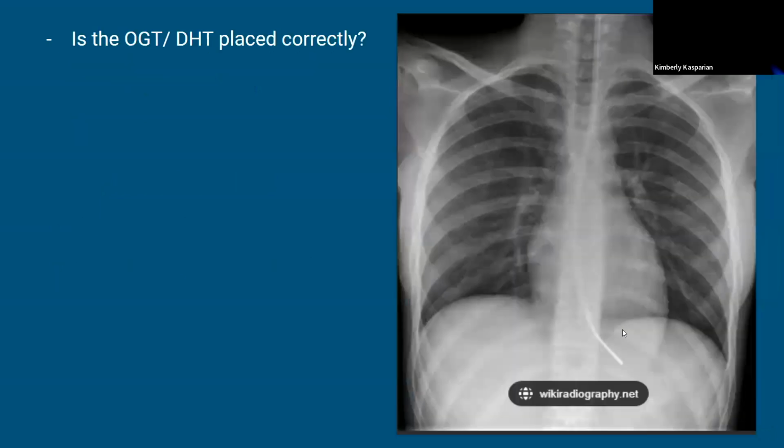The other clinical scenario is this: is this Dobhoff or OG or NG tube placed correctly? And why? Yes or no? I mean, I would say yes, it's in the stomach, but it's not that far down.